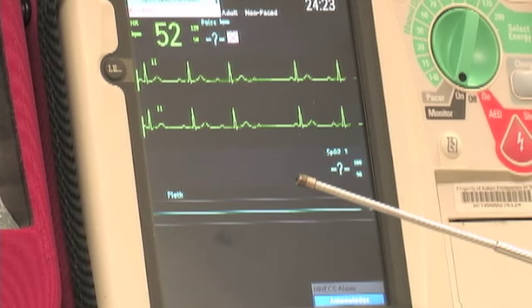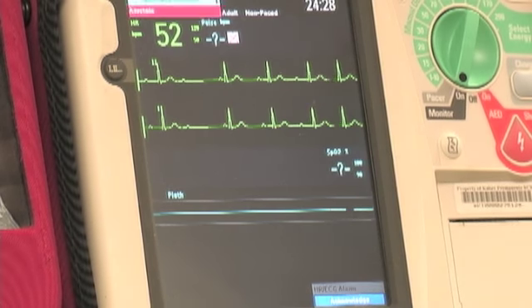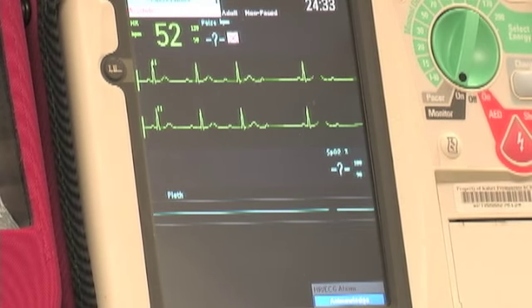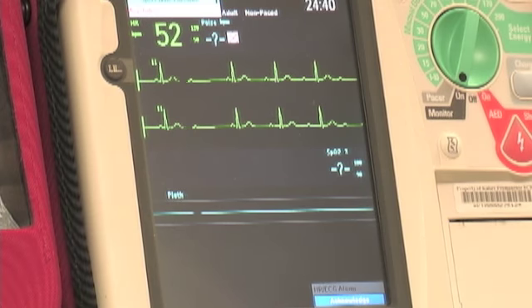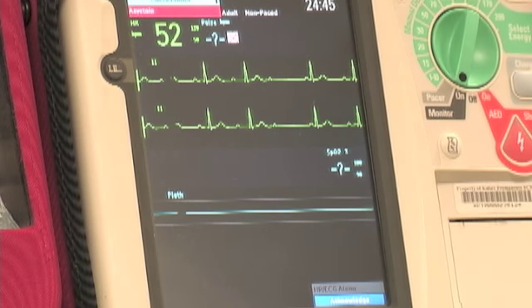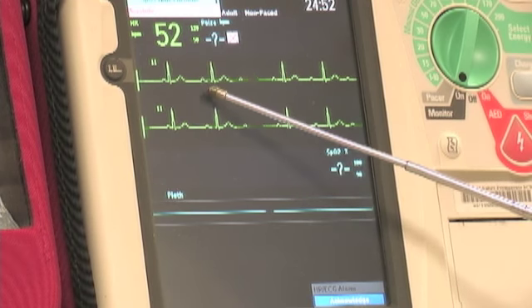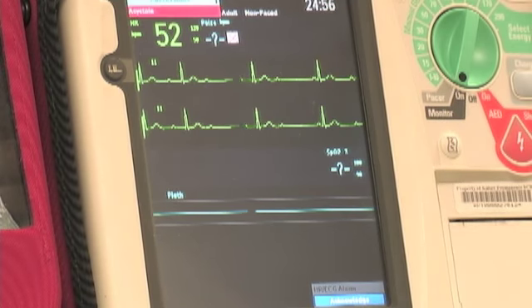So it's kind of giving us a warning as to what's coming, and warning starts with W, and W is for Wenckebach. So this is a second-degree type 1 or Wenckebach type of block. So this one's a little bit more concerning than the first-degree AV block, but still it's usually not too bad. It usually doesn't cause unstable symptoms in a patient. So PR interval, longer, longer, longer, drop, no QRS. This is a Wenckebach.